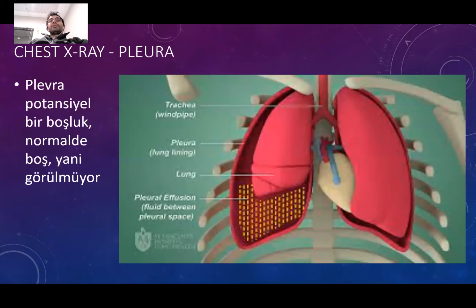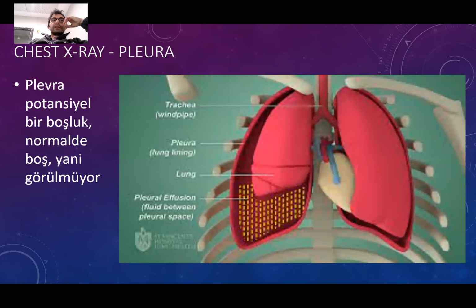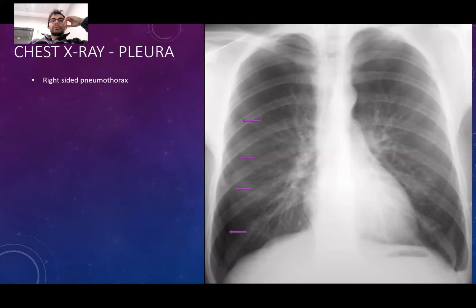So we come to pleura. We finished mediastinum. We come to pleura with this. We are starting. So yes. And this, no, yeah, this one.